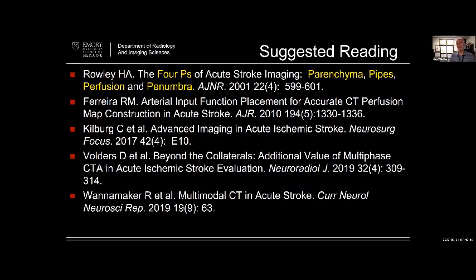What I see on the head CT that's sometimes difficult to figure out if it's blood or not are islands of spared tissue, where they maintain their density and then they have edema next to it. And that generally stands out because of Mach effect. Remember, if you take one density and put another density next to it, it's going to maybe look more or less dense because of what's next to it. And if I'm not sure, I'll say I'm not sure. Then typically they'll get an MRI anyway, and then you'll have a good idea, right? Between GRE or SWI, you'll have a good idea about what the hemorrhage looks like.